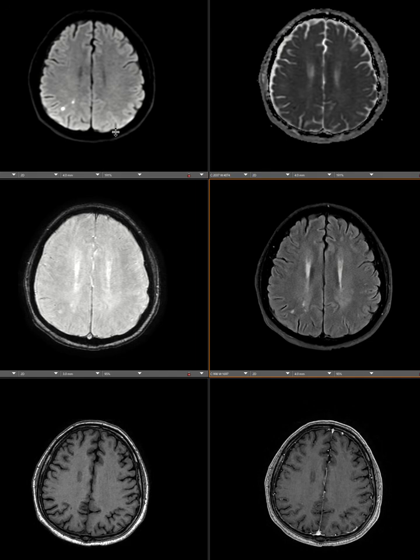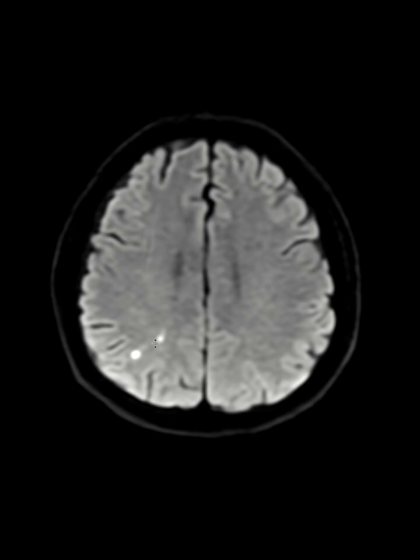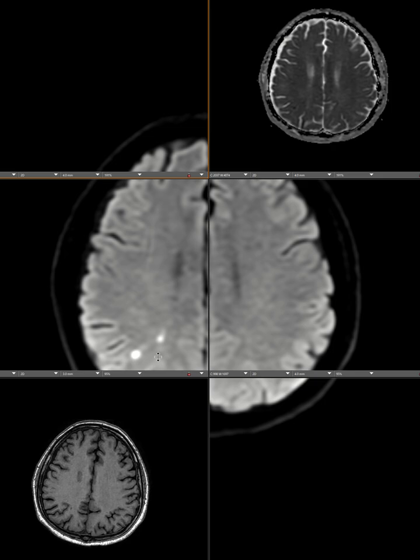Basically, this is a manifestation of acute infarct when we have some parenchyma that is dying, and then we have cytotoxic edema, and it decreases the movement of the water molecules, and it's called basically restricted diffusion of those water molecules. So acute infarct equals increased areas of restricted diffusion. Make sure to always look at the ADC map on this one. We should have correlation with these dark signals, and this is going to be acute infarct.